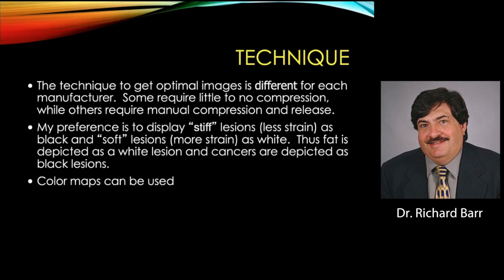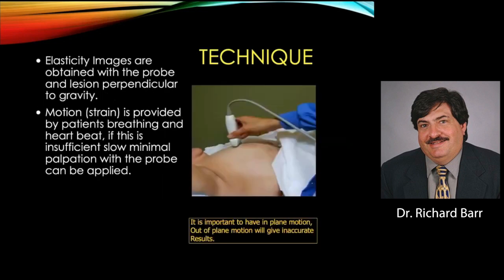And there are many, many color maps. But again, I recommend you not use them because I think we can do a better job when we use grayscale imaging.